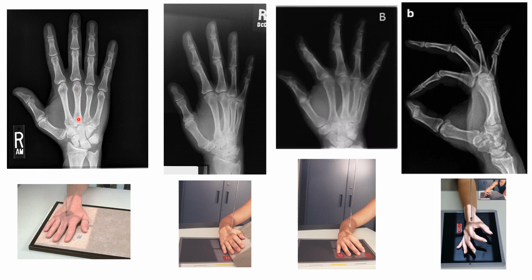So we'll also be looking for the metacarpals to be an equal distance apart. So we want separation between the second and the third, the third and the fourth, and the fourth and the fifth to be an equal amount of distance between each of those metacarpals as well as the phalanges. And we want to make sure that the soft tissue margins don't overlap here at the phalanges. The open joint spaces tell us that the patient's hand was placed parallel to the IR, and the proper central ray placement was used with a perpendicular center ray.